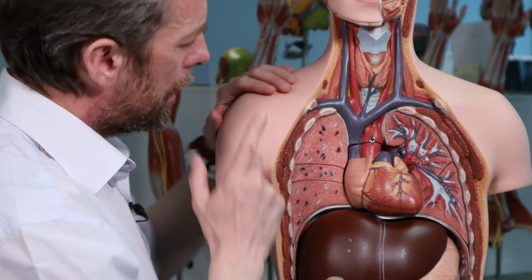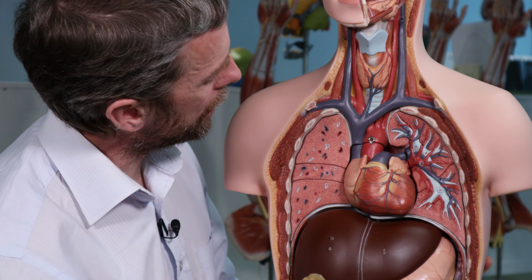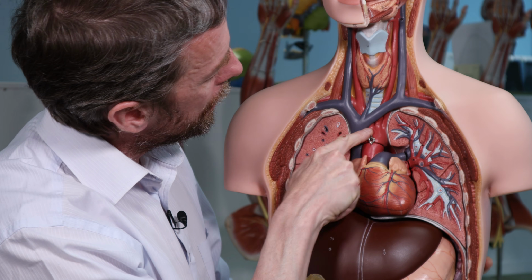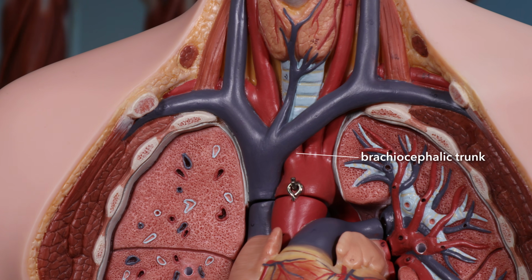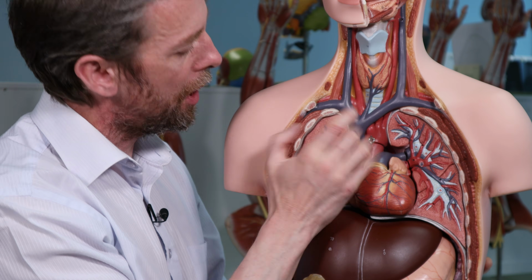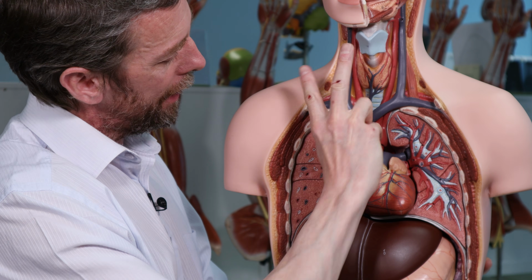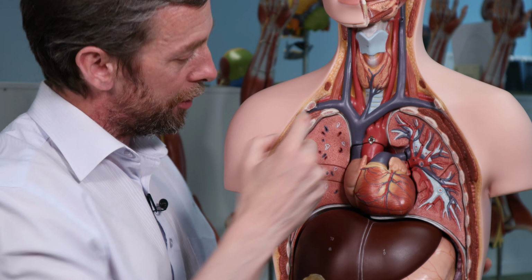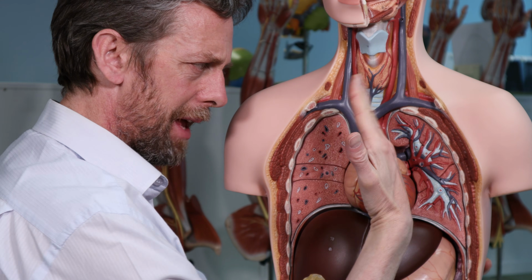And we'd better do the branches of the arteries from the arch of the aorta, I should think. Okay, so what are we looking out for? Well, you can see the arch of the aorta curving over to the left. The first branch is this brachiocephalic trunk, so it's going to be posterior to this vein. The brachiocephalic trunk is going to go from the arch over to the right, and it's going to divide into the common carotid artery and the subclavian artery on the right. So we need to look for the brachiocephalic trunk if we can. That's going to be at a bit of an angle.